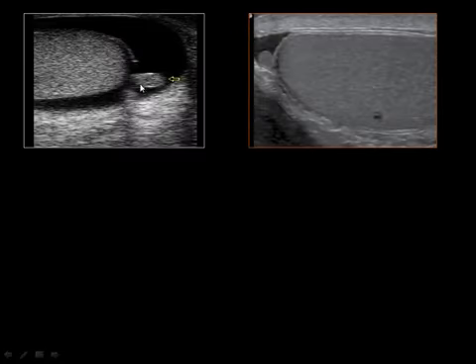It can be easily seen with color Doppler. The appendix testis is usually seen when there is fluid. It is normally a small, round prominence extending from the upper pole of the testis. It is only 1 to 3 mm long and isoechoic with the testis.